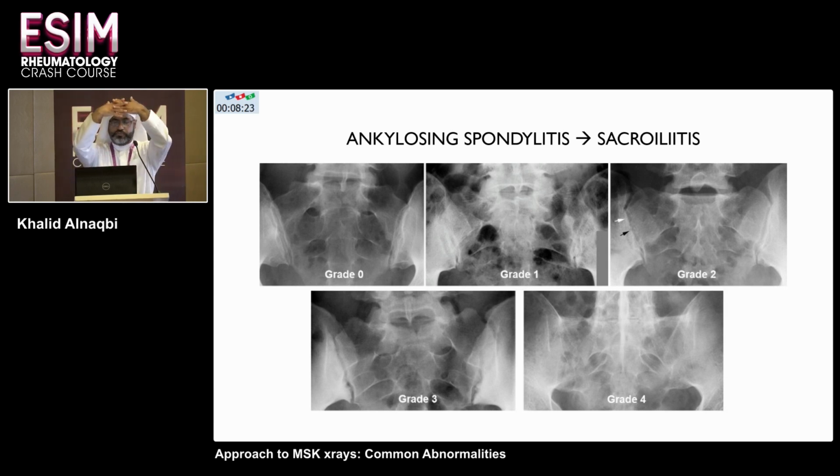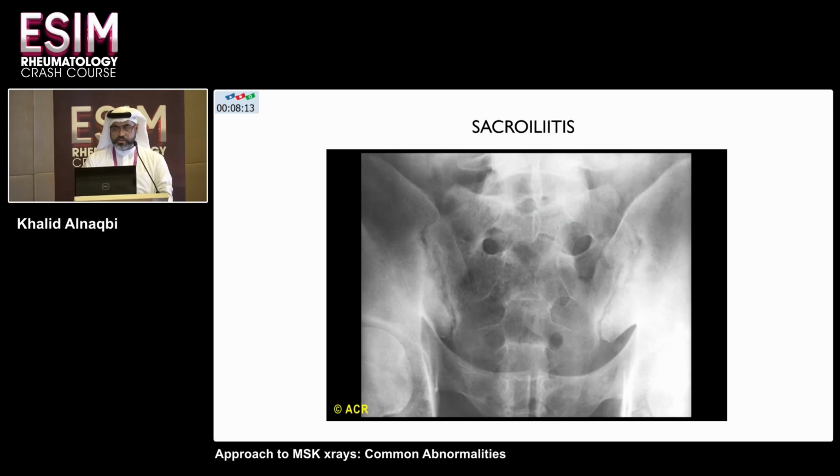So complete fusion. Thankfully, not all patients have this. Mostly men, and not all men like this. 40% of men have this ankylosis after 10 years. So this is another image, which shows you that the sacroiliac is eaten up.